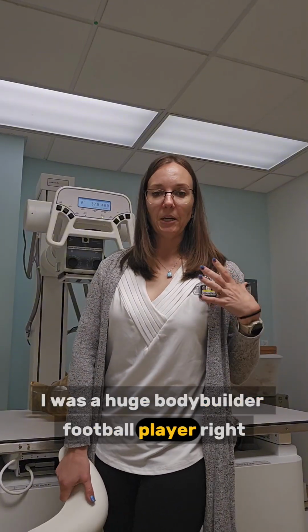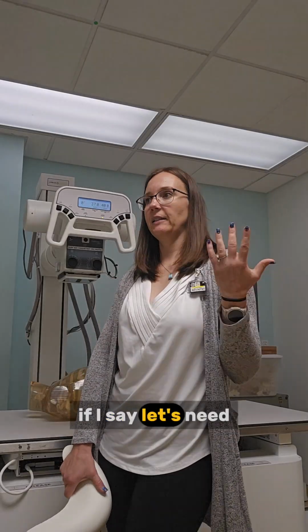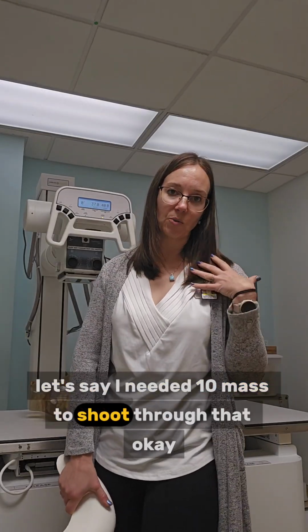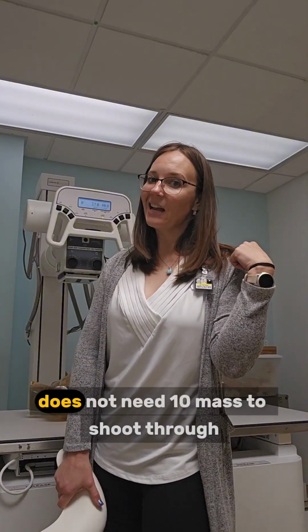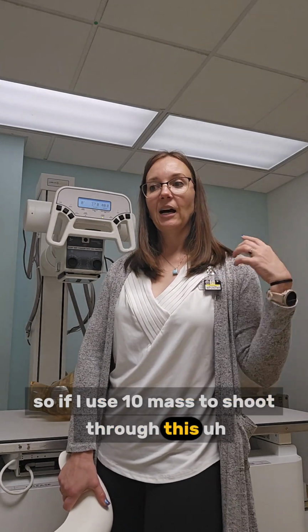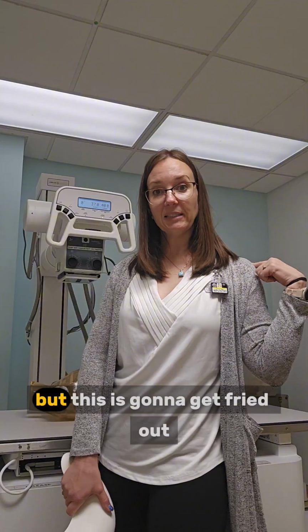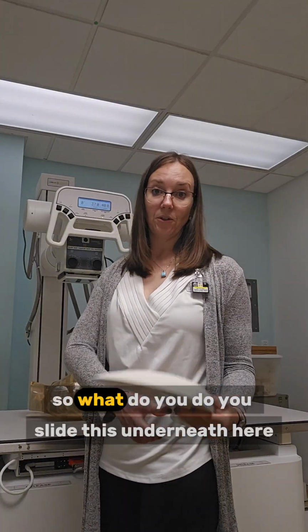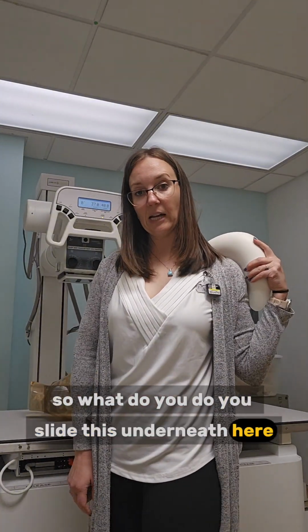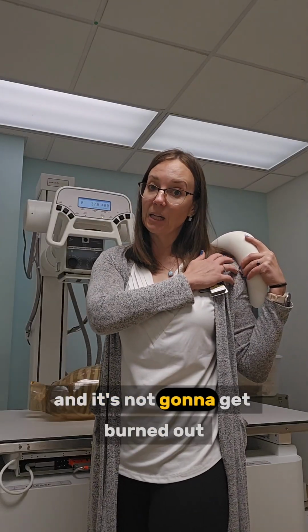If, for example, I was a huge bodybuilder or football player, my pectorals are going to be way out here. Let's say I needed 10 mAs to shoot through that, I'm just making up numbers. The AC joint, this little tiny guy, does not need 10 mAs to shoot through. So if I use 10 mAs, maybe my scapula and everything in this area is going to be well exposed, but this is going to get fried out. So what do you do? You slide this underneath here, and now if I use 10 mAs, the whole area can receive 10 mAs, and it's not going to get burned out.